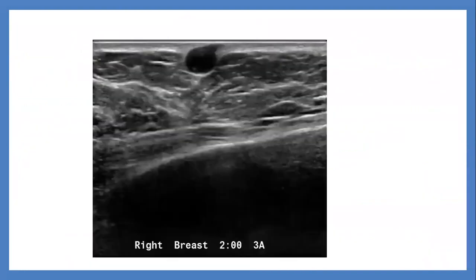What about this lesion, Medina? Can you tell me hypodermis or dermis and why? This is a well-defined hypoechoic lesion of dermal origin with claw sign and skin lesion sinus tract. Excellent, well done. Both claw sign and sinus tract signs are seen in a dermal lesion. Mostly it will be an epidermal inclusion cyst. Excellent, well done.